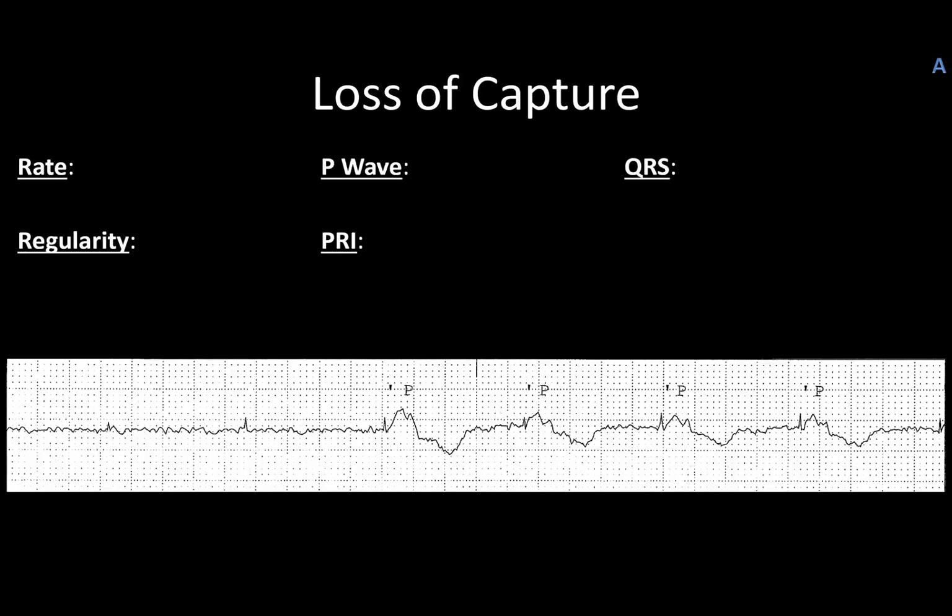So here's a real-life example of pacemaking from my collection, and we'll just go ahead and mark this like usual. So we have a heart rate of 40. But our pacer is set to, that one comes out to right at about 22.